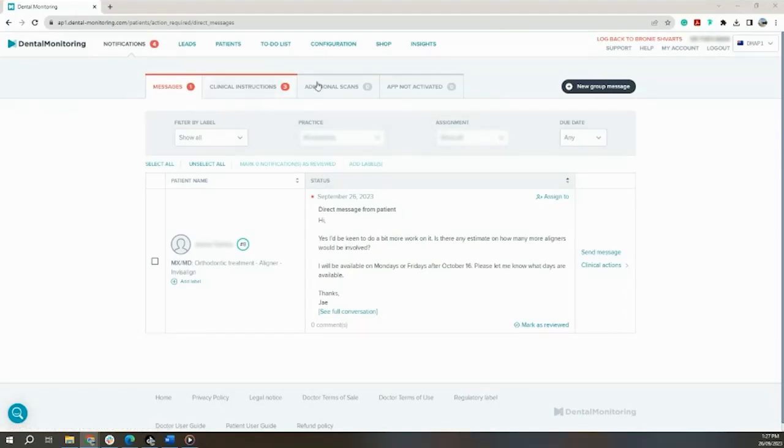So I've changed the dashboards and I'm now in a currently active doctor's dashboard. And that's why, as you can see, all of the areas are redacted. So obviously for privacy purposes, we are not able to give more information than that, but that will still give you a lot more of the detail about what type of information you could expect when the patients are being monitored.